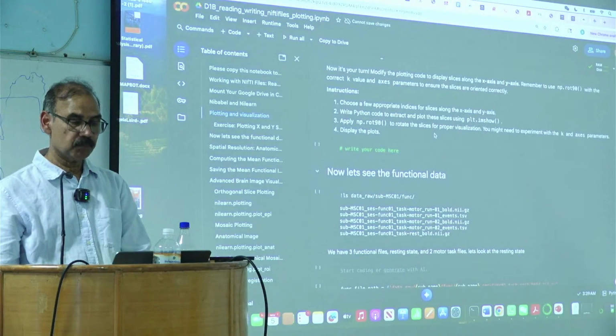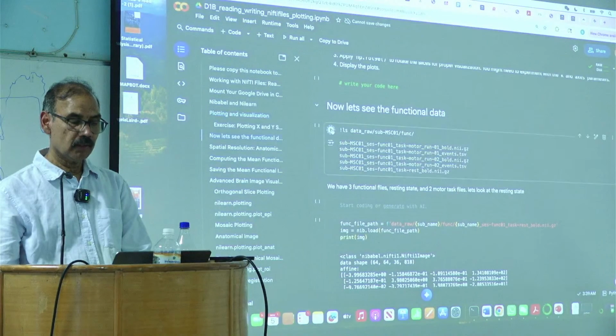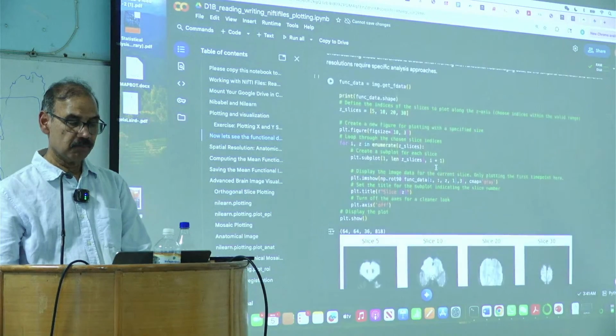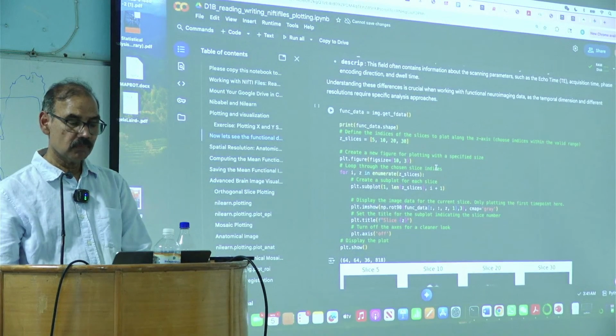So this one is imshow functional data colon comma colon, rotate.